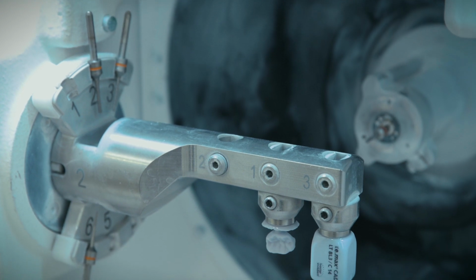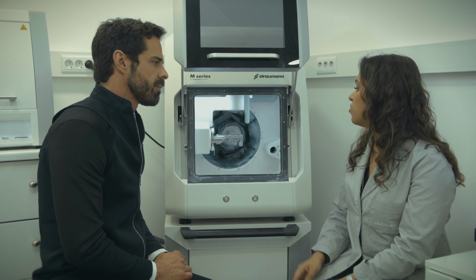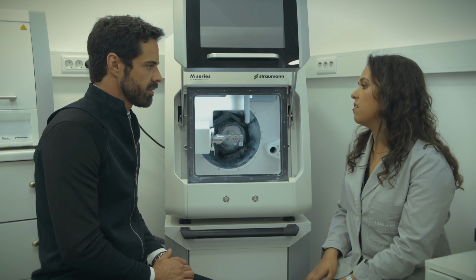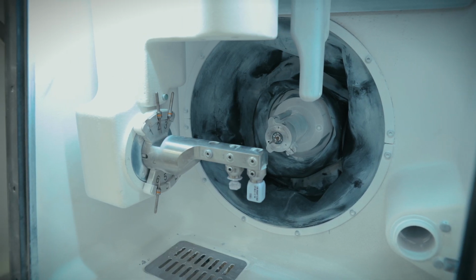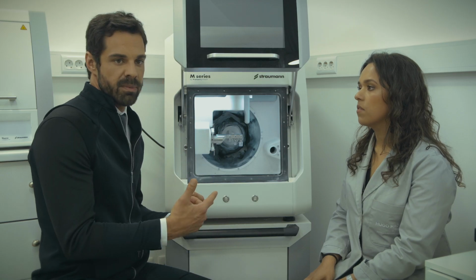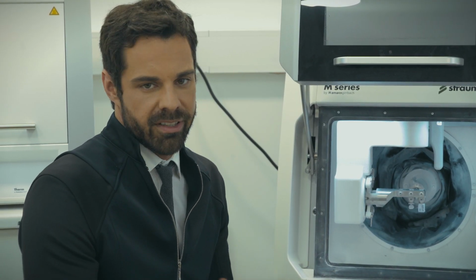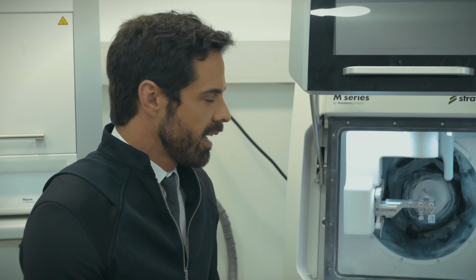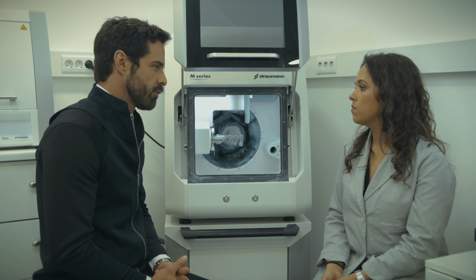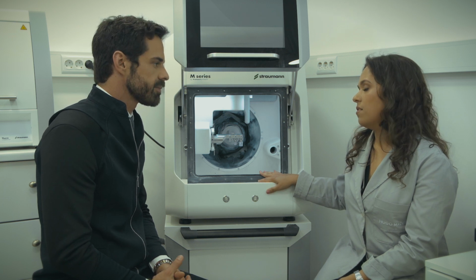Yes. And after this, is any kind of process necessary before the crown? Only crystallization. And how much time does the crystallization take, for example? 10 minutes. Okay, this is a reduction process. We have a block, and then with the drills inside of this milling machine, we can transform the block into our final product, our crown, our veneer. How does the milling machine receive the information to produce this kind of work? This milling machine is connected to the software and is very fast.